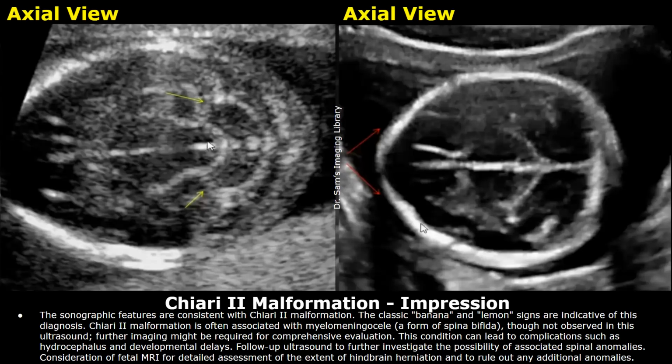This condition can lead to complications such as hydrocephalus and developmental delays. Follow-up ultrasound to further investigate the possibility of associated spinal anomalies. Consideration of fetal MRI for detailed assessment of the extent of hindbrain herniation and to rule out any additional anomalies.